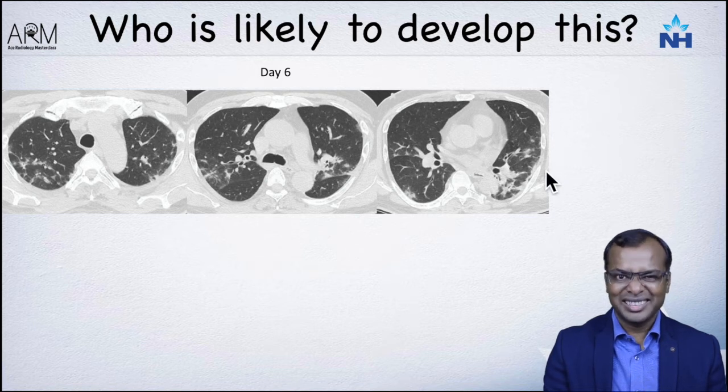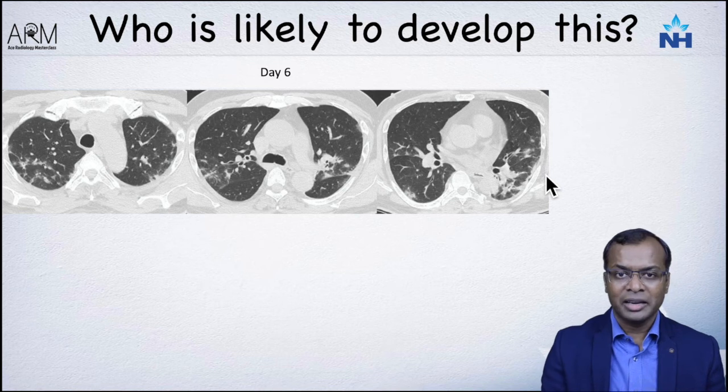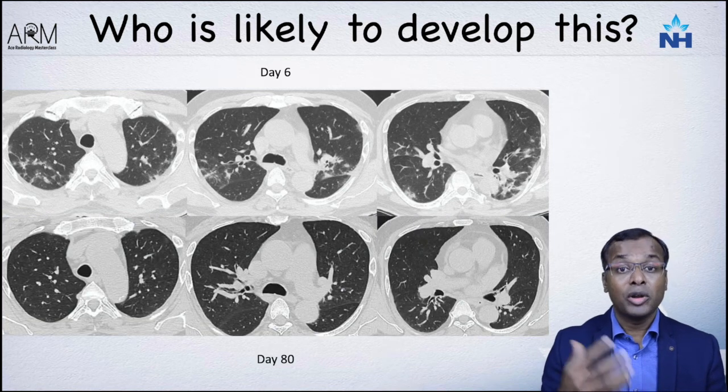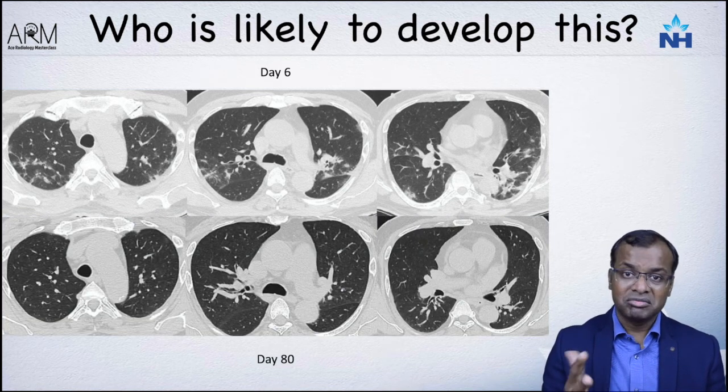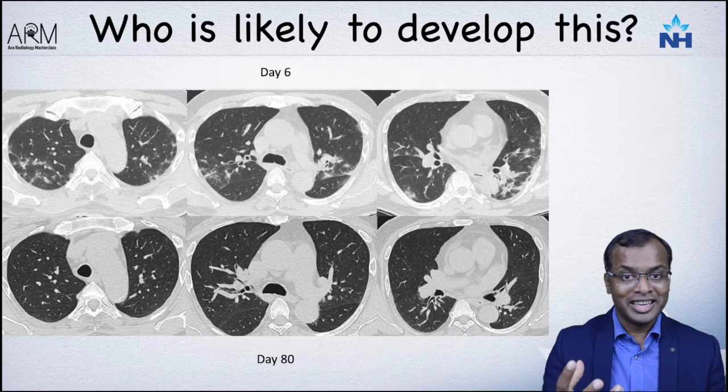You can see that this is relatively widespread. He had other foci also in the lung. And then when we follow him up nearly around 3 months, you can see everything is almost gone. Okay, a moderate disease completely resolved.